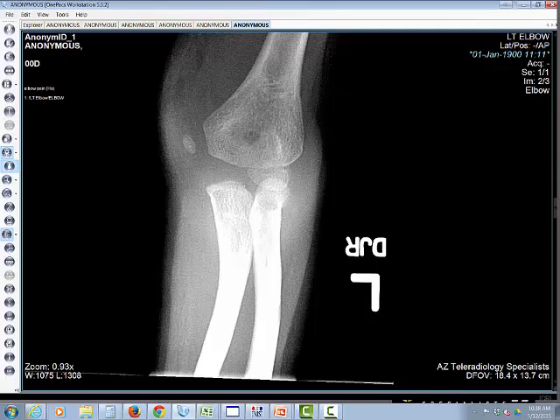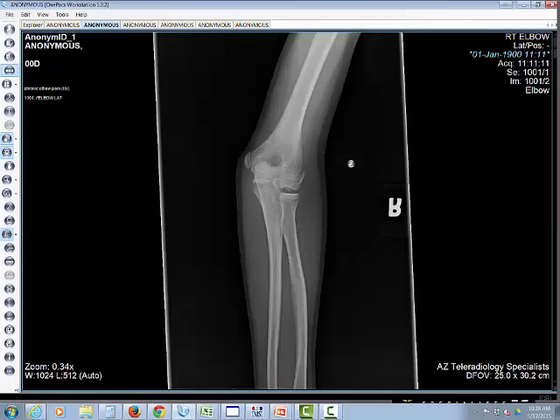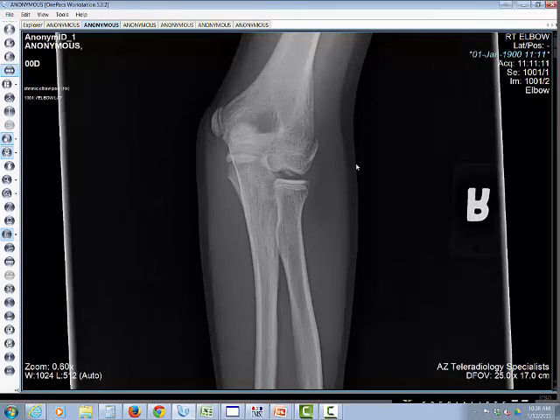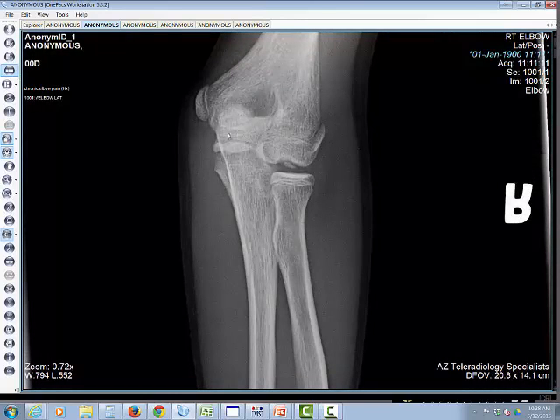All right, moving on, we're going to go to another pediatric injury here. Well, let me flip that over for us. All right, so here's another young patient here presented with an elbow injury. And here we can go through and see all the ossification centers. This is the medial one, closely opposed to the bone as it should be. Here's lateral, a little bit more inferior position.